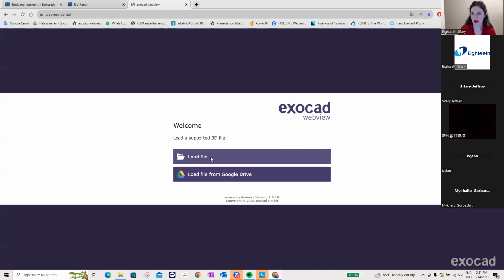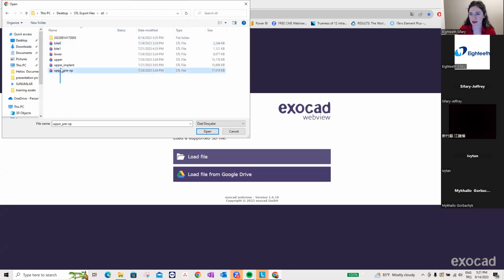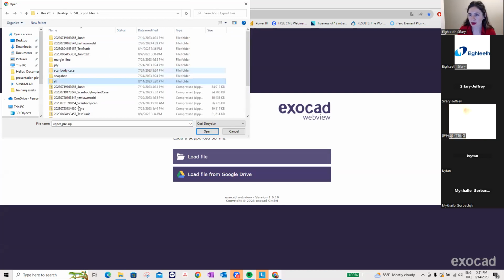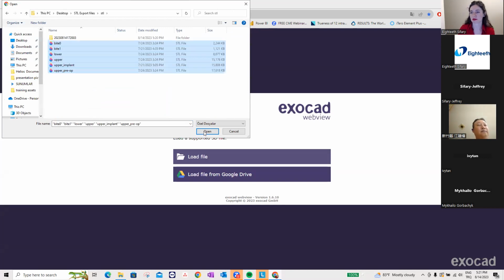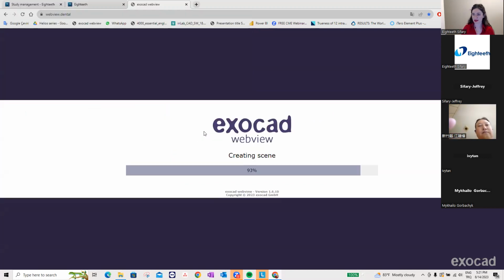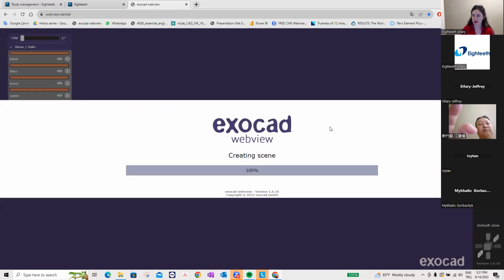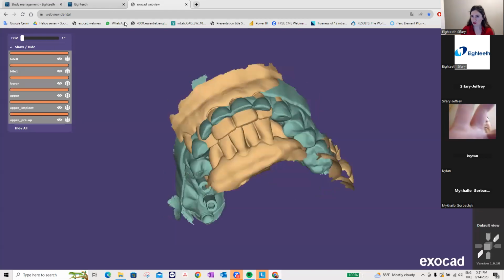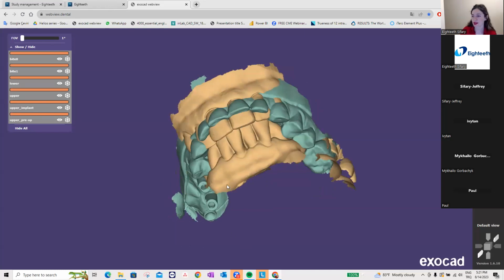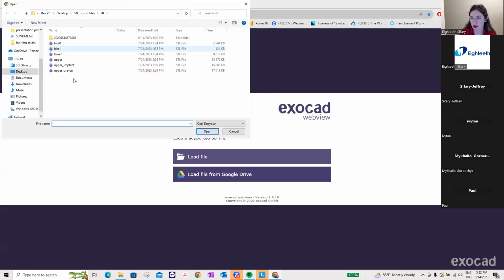Let me show you an example. They click and load file. Yes. Not this one. It doesn't matter for me. So this is an implant file, but it's okay. If you import those files, now, it's not this one. Yeah, in the load file, I couldn't find them, not this one, but maybe, yeah.